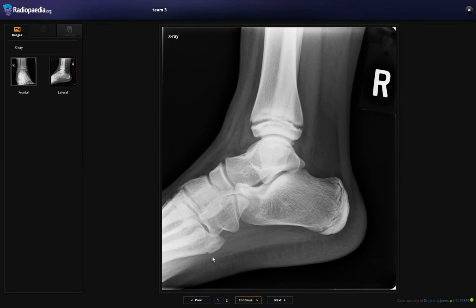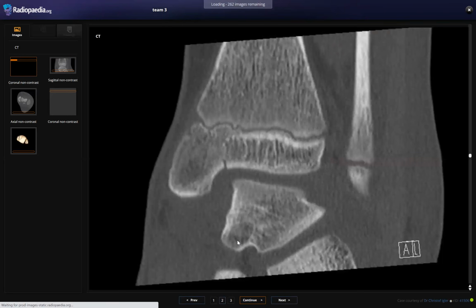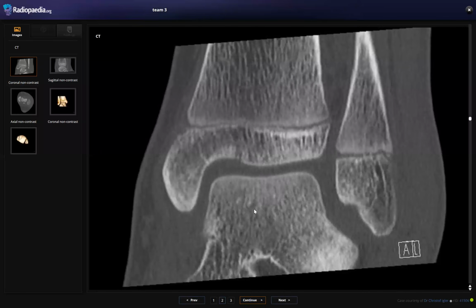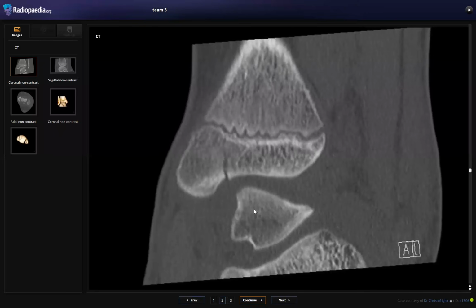The child needs the MRI. Why MRI? Or CT scan, at least some advanced imaging to see the growth plate or any Salter Harris injury. Okay. So the CT scan again confirms the irregularity and sclerosis around the growth plate. And there is a fracture in the distal epiphysis as well. Can you scroll? Yes. Okay, so there is a vertical fracture along the distal epiphysis. And so I'm looking for any other component.